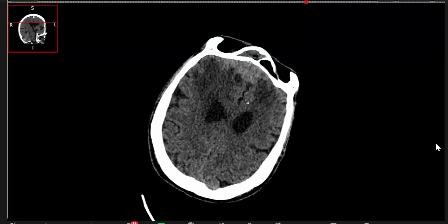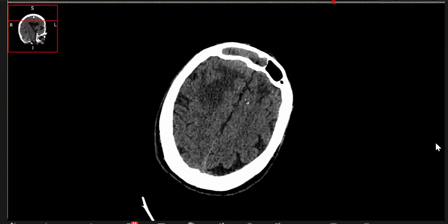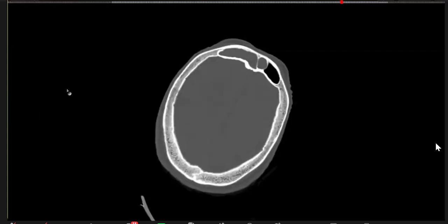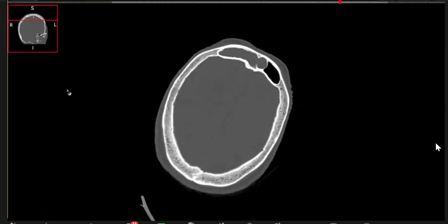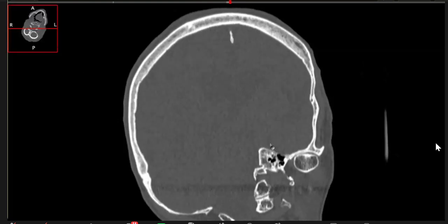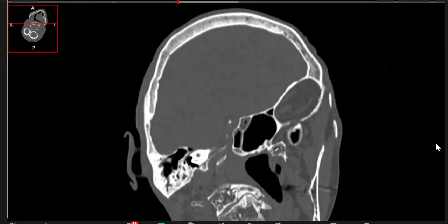I would like to see the coronal and bone window to confirm my findings and the extension of the disease. You want to see what? Coronal bone window. Yes. Here you are. The patient is not cooperative, so it is quite a rotated type of skull. Yes.